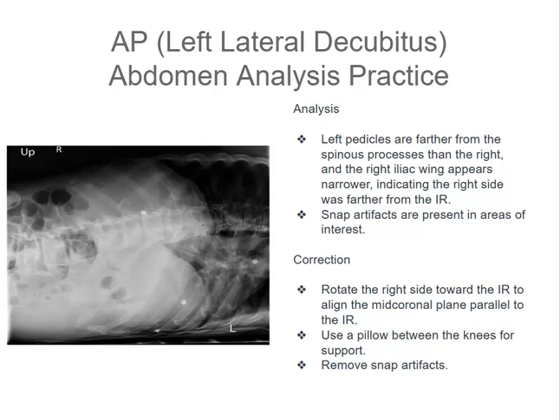First, I want to look and see, do we have all our anatomic structures? In this case, we do have the diaphragm. We have a little bit too much diaphragm, so I do suggest some recentering here. Typically, most protocols require the pubic symphysis to the diaphragm, so this may require two projections, one lower abdomen, one upper abdomen. Or if you don't have to have pubic symphysis, then we should be centered around L3. Once you fix the central ray issue, we need to talk about whether or not there's rotation here.